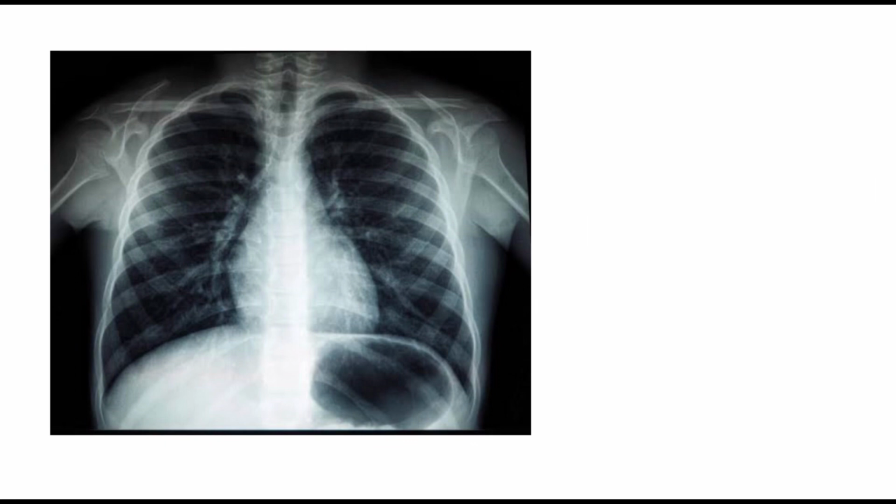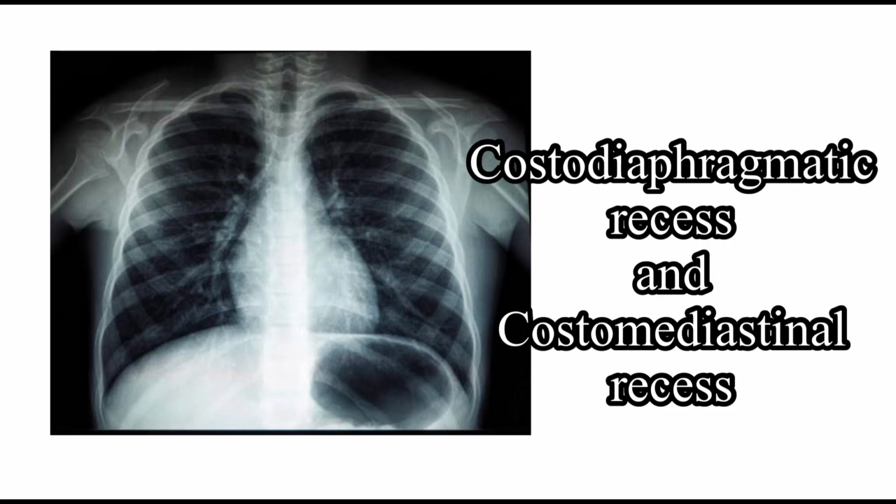Check for the costodiaphragmatic recess and the costomediastinal recess. The costodiaphragmatic recess is present more laterally between the lungs and the diaphragm, and the costomediastinal recess is present more medially between the lungs and the heart.